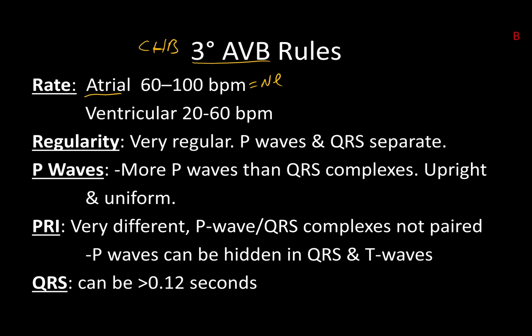There really shouldn't be anything too exciting going on in terms of the number of P waves and the rate they're moving. But what you will see is this. The ventricular rate, the QRSs that you can identify and count, that's definitely going to be bradycardic. On rare occasions, it might actually be a normal rate, but that doesn't happen all that often, at least in my experience.